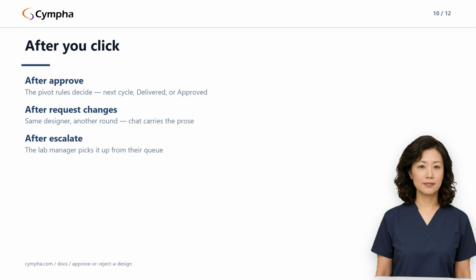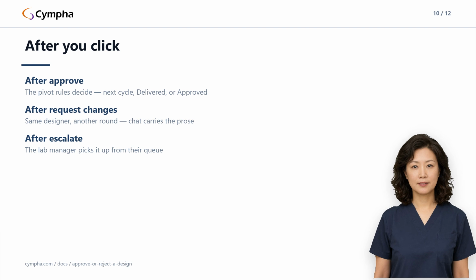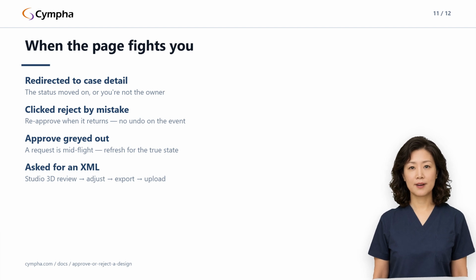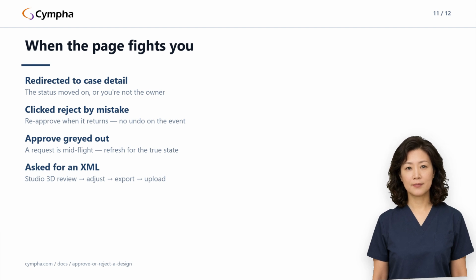For common frictions and fixes, the approval page keeps redirecting you to the case detail. Either the case is no longer at awaiting approval, someone else approved it, or it got moved, or you're not the case owner. The badge on your dashboard row tells you the current status. Clicked Request Changes by mistake? You can reapprove later. When the designer resubmits, the case returns to awaiting approval and the approval page comes back, but there's no undo on the immediate rejection event itself.